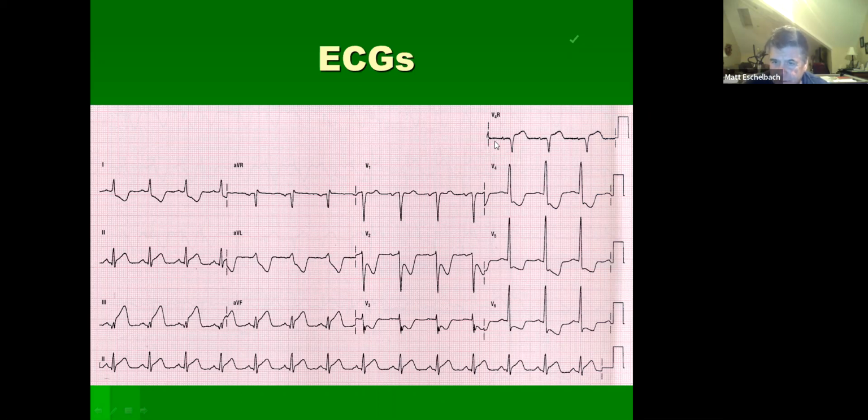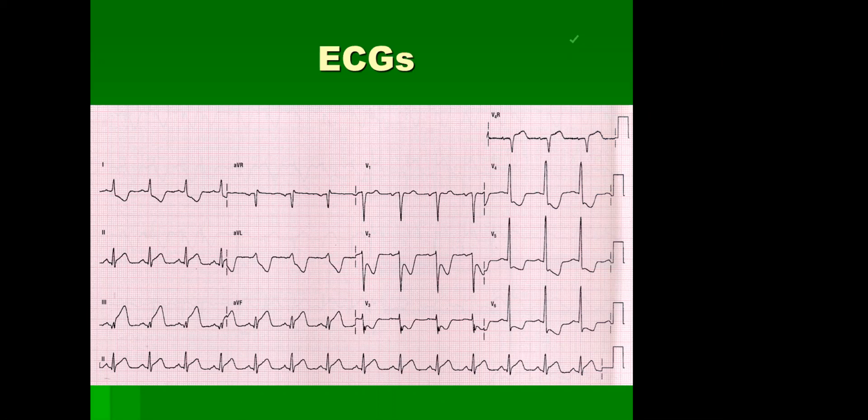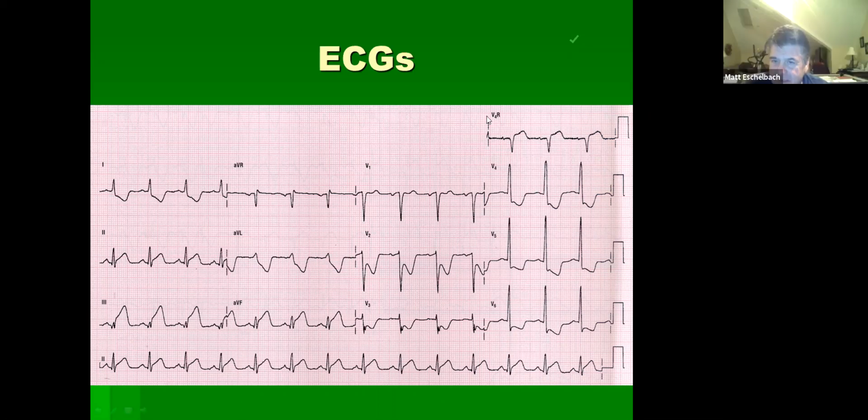What is this one right here? Somebody threw in an extra lead. No idea. That's cool. Okay. Read it. It says V4R. That's a right-sided heart lead.